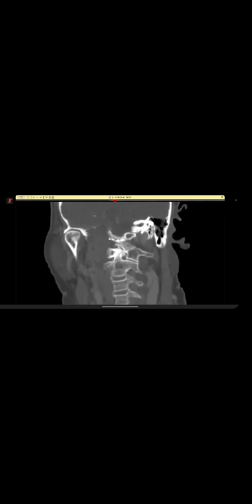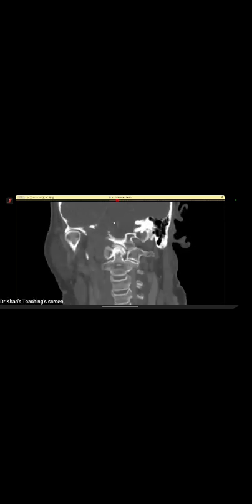And in the exam, I'll ask you this. I'll show you a coronal, and I'll ask you what is happening to the jugular tubercle? Where is it? What is happening? So you have to tell me that this is. If I go to post contrast, you can see this mass here. So this is a jugular foramen mass also indirectly. And this is how it behaves on post contrast.